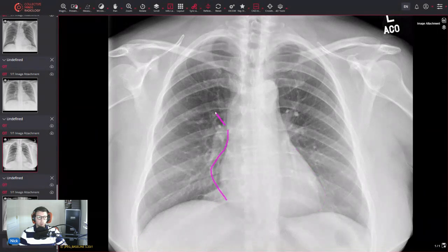We go up, we can look at the hilar. We look at the right hilar angle, make sure there's no bulkiness of the hilar, make sure we can distinguish vessels coming out of the hilar. Are they both the same density? The left hilar is usually higher than the right. And then we make our way up over the aortic knuckle and up the superior mediastinum, make sure there's no lymphadenopathy, no tumours lurking there.